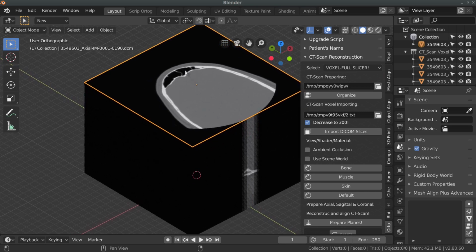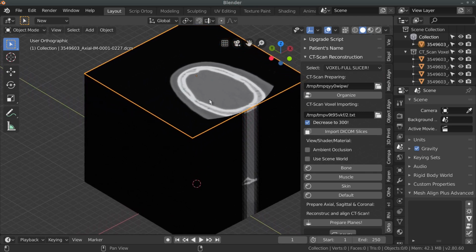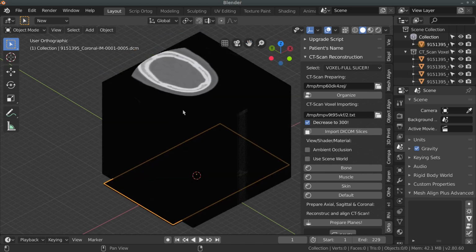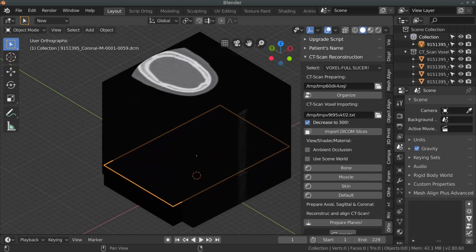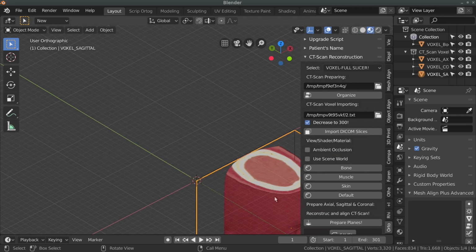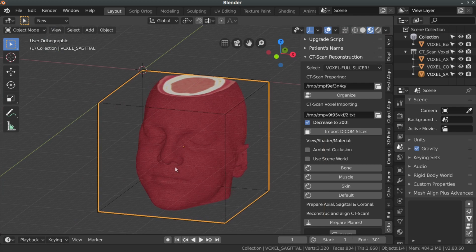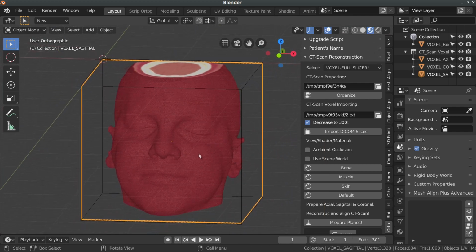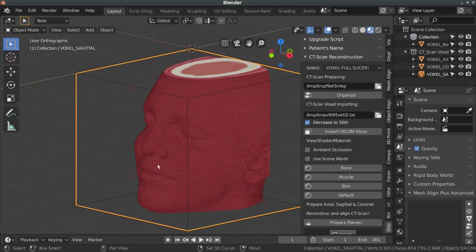After this, the slices will be imported, like you can see here, and like this step takes some minutes, I will stop the video a little and come back when the process finished. The import has been completed, so you can see the rendered voxel data here and orbit.